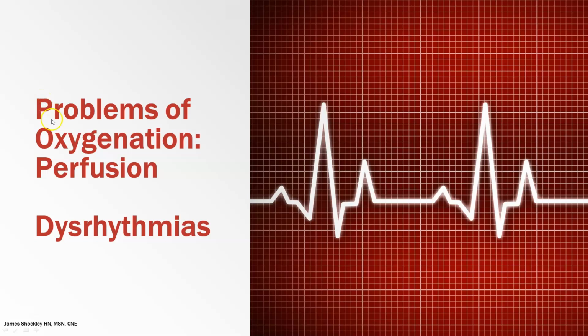Okay, so we're going to actually begin looking at the individual rhythm strips themselves. The first thing that we're going to look at are our sinus rhythms. Although technically they're not dysrhythmias, they're part of the dysrhythmia lecture.